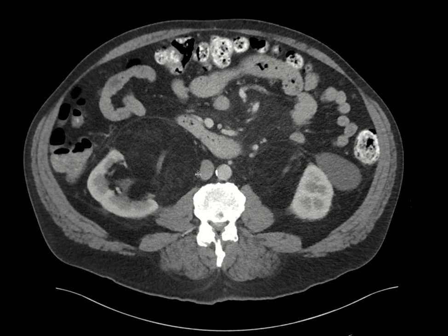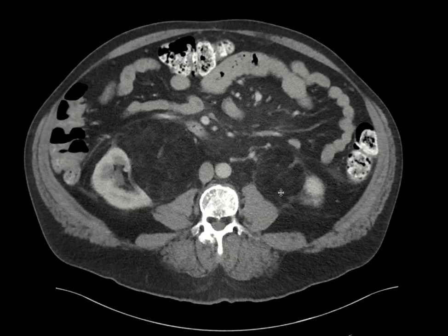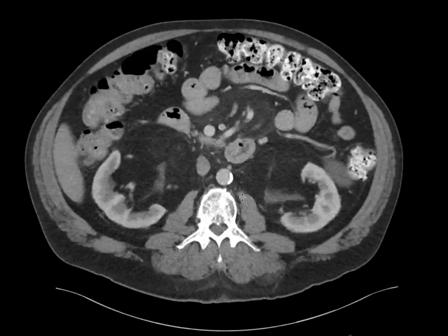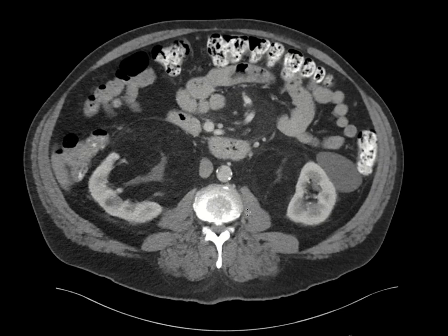Here's the ureter coming out, and then on the left you can see the ureter coming out. Similar appearance, it's flattening the kidney here, and so there's a differential for this. One of the things you think about is renal sinus lipomatosis. Renal sinus lipomatosis is a benign proliferation of fat in the renal sinuses that spares the renal parenchyma.